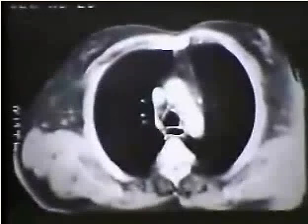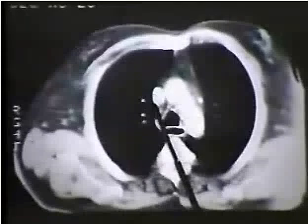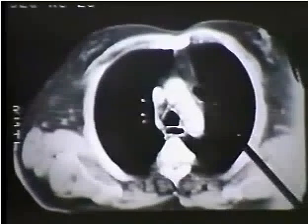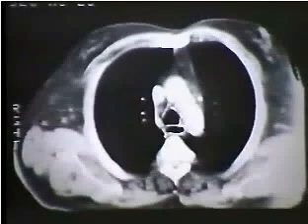Here we start off, as you see, at the level of the aortic arch, which we're now familiar with as our starting point. Nice demonstration of a portion of the azygos vein. And here, someone who has a very patulous air-filled esophagus. In the fat pad, lateral to the aorta, we just see a vascular structure in cross-section. We don't see anything else yet.